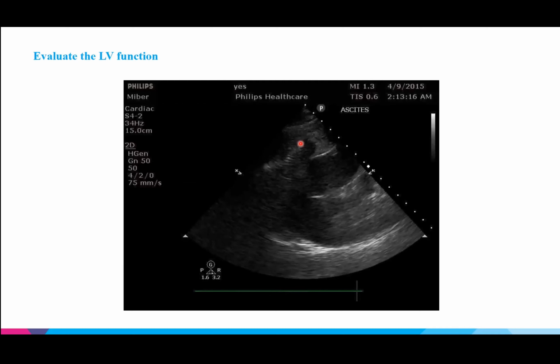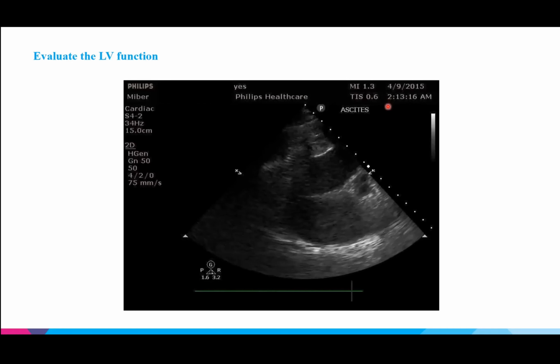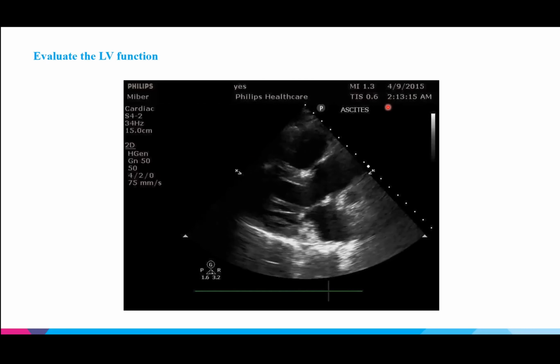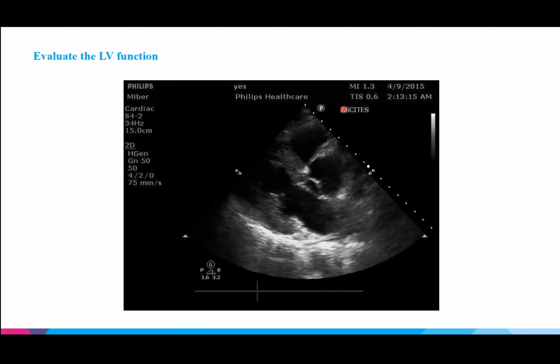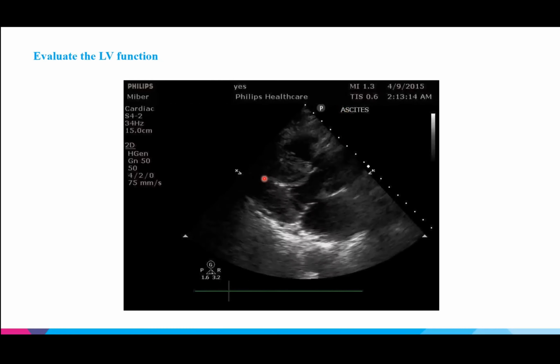All right, so we have 85% with hyperdynamic and then 12% say normal. And then I think maybe 1 or 2 people said reduced. So if we look at it, so what is this view? So this is actually, I will say the society is throwing, I don't know what this is meant to be. So we have to try and see what structures we can identify, right? So what is this over here?